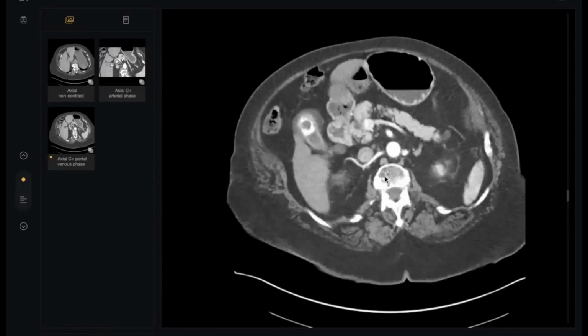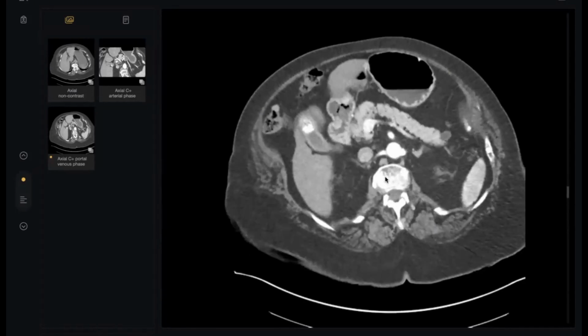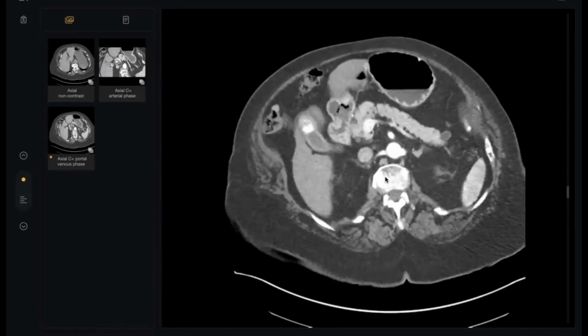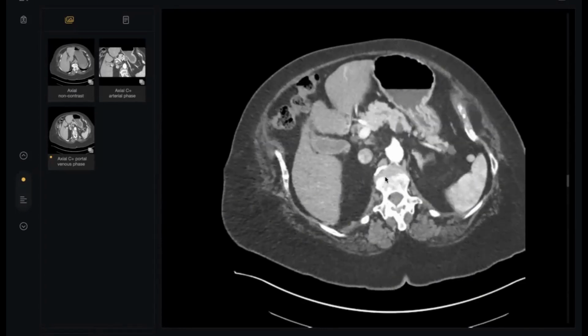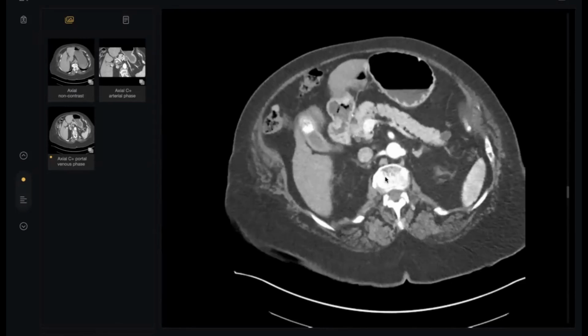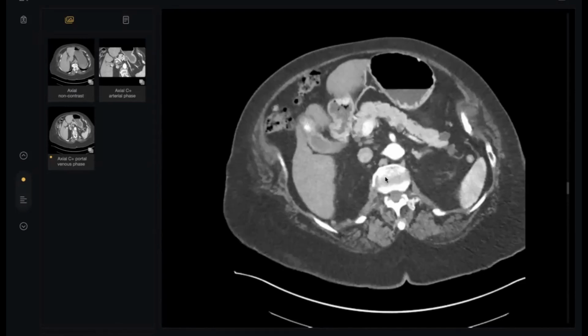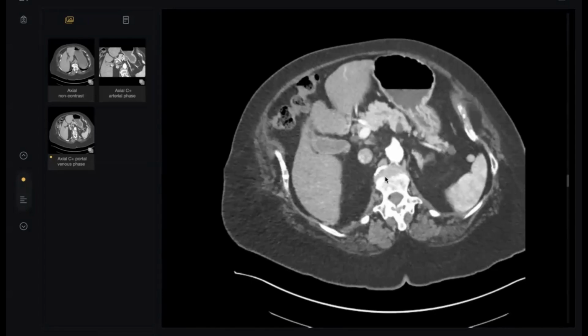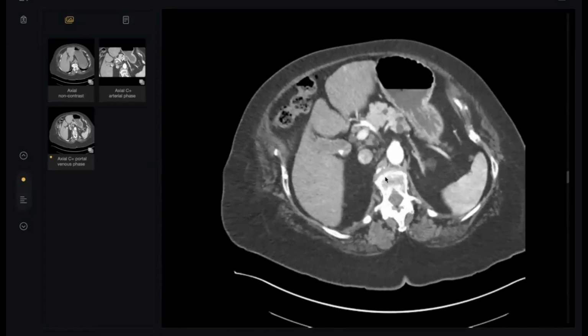Yeah. So actually, there are multiple cysts. Like there's a cyst in the tail as well, beside the body and the head of the pancreas. I cannot see a direct relation with the vessels, and the vessels are opacified normally. Doctor, look at the neck, please. There are cysts at the neck. Actually, I can see a cyst, and it looks like the duct could be communicating to one of the cysts.